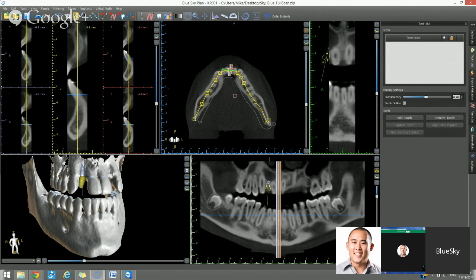Okay, the subsampling type, I'm not going to get into that now. It's different qualities and resolutions that the DICOMs could be imported at. Unless you have a reason not to use max, unless your computer can't handle it, then go ahead and use max, and that's it.